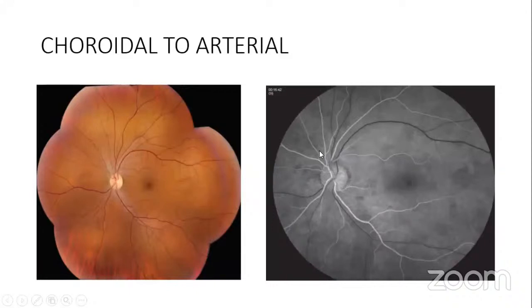So you watch the timing, you look for the timing. And I said for the basics, you are meant to have a fundus photo of the eye, and you have to have a pre-injection photo with the barriers there without the dye. And then you start taking your fundus photograph. So those three should be there. The fundus photo gives you a guide, or if there's hyperfluorescence somewhere, you note where it is coming from, in relation to your fundus photo.